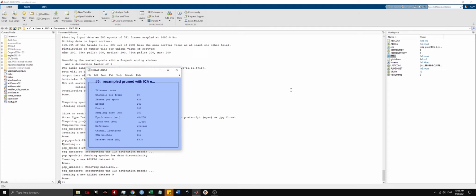Cool. So one thing I would like to mention that I do differently from others is I like to extract the epochs from all trials and conditions at the same time. Other people will sometimes extract one condition at a time. The reason I do everything together is that it preserves the order of trials, which is important if you want to do trial-level analyses. Then I merge the EEG data with behavioral data in my Excel spreadsheet, and I use that to keep track of my data.